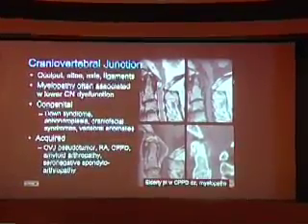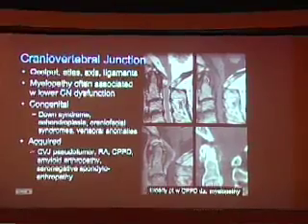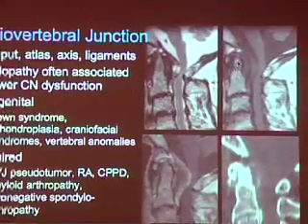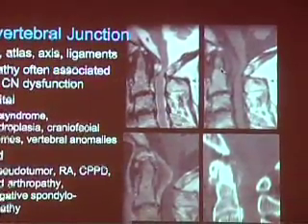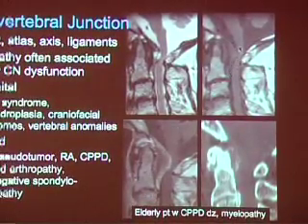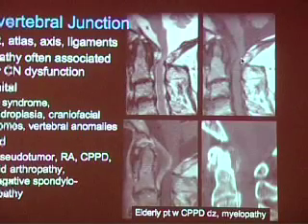Well, here's a sagittal T1 weighted image with dark fluid, bright fat. You see up at the level of C1-2 that the C1-2 interval looks pretty good. The dens is not whittled. This is not a patient with rheumatoid arthritis, but he's got this large mass of abnormal soft tissue, which is markedly squeezing the upper cervical cord.